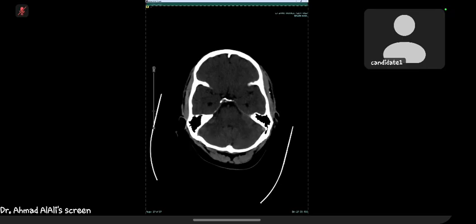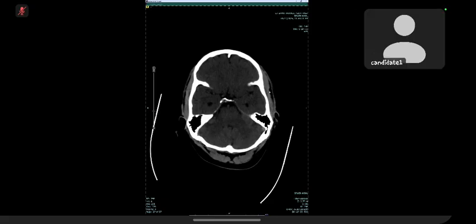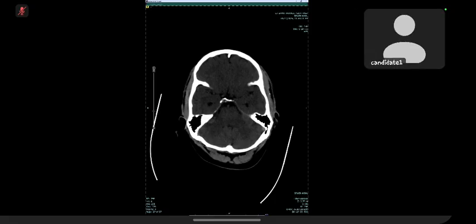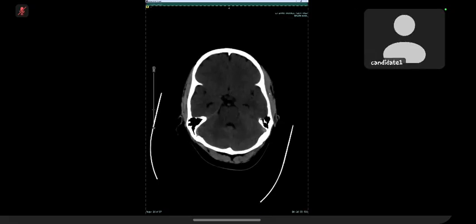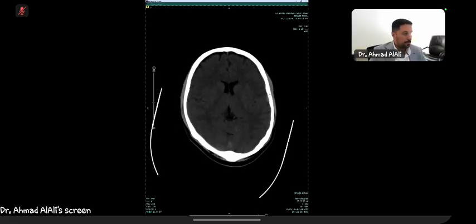Okay, so what would you do? In my routine practice, I will check it in the stroke window. The stroke window revealed nothing much beyond what you've already described, so what else?